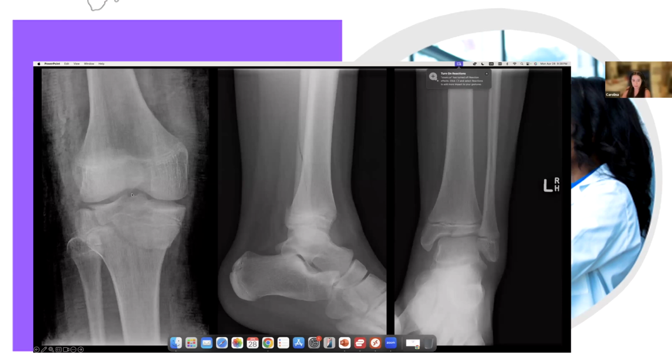Now, so we were doing Salter-Harris type 2, Salter-Harris type 3. Now we are seeing a very blatant Salter-Harris type 4 fracture in which you have a vertical fracture through the epiphysis. It goes through the growth plate and exits obliquely through the metaphysis. And here we have this fracture that goes through the fibula as well, but it goes through the metaphysis, growth plate, epiphysis, metaphysis, growth plate, epiphysis. It goes all the way. And in the distal tibia, this fracture is called a triplane fracture.